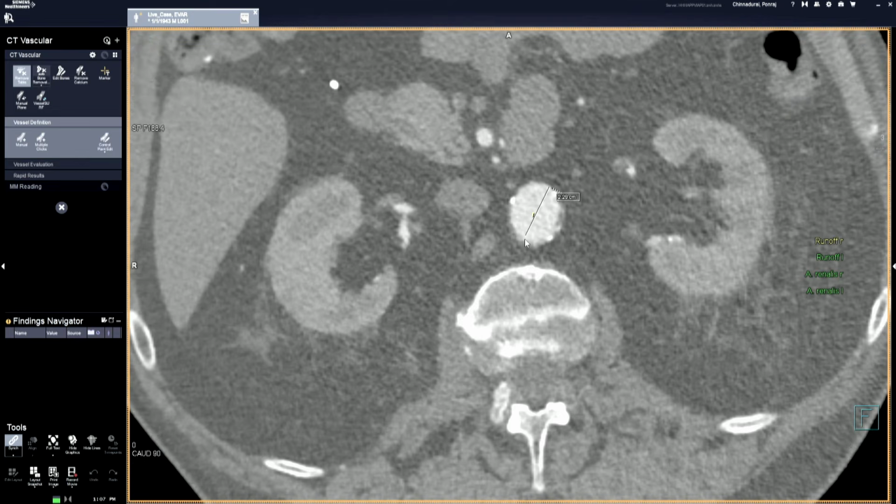Okay, so here is our aortic diameter. How many of you have done this? Especially if you are getting a rough estimate of where the neck is, this is a good technique. But what I wanted to show you is the slice that we are measuring here.